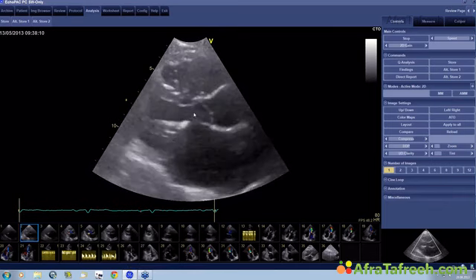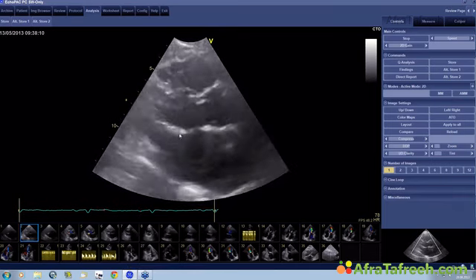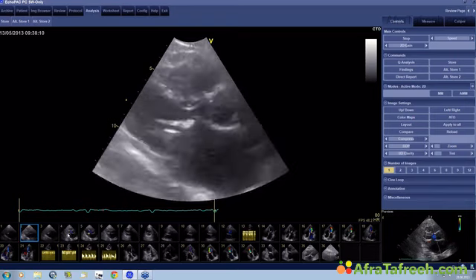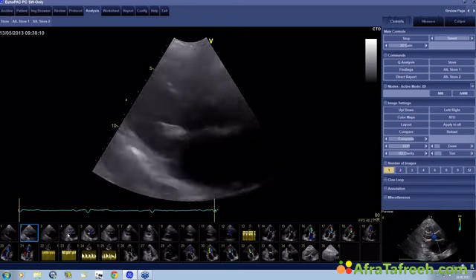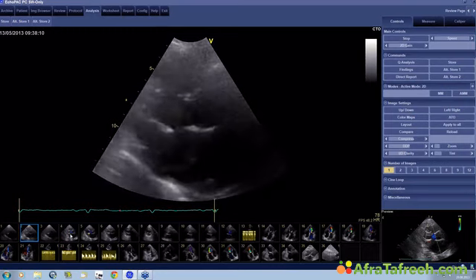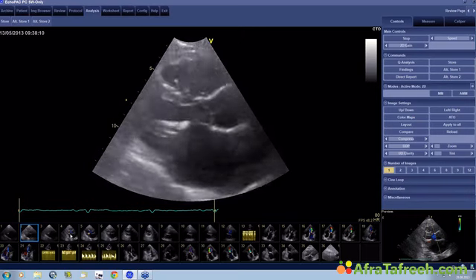Even though the image quality is not terrific in this case, I think you will all appreciate that there is doming of the mitral valve. So the diagnosis is quite clear. The only question, where is it, and how strongly is the valve affected by rheumatic disease?